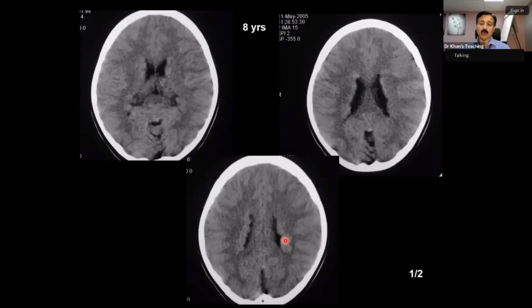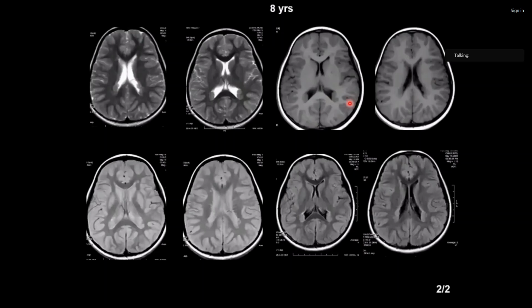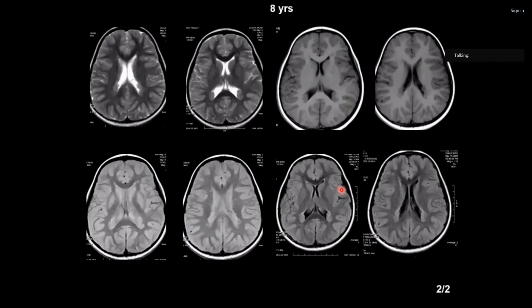Hello? On a CT scan, and you can see these nodules, bilateral nodules. And on each sequence, which will be T1, candidate 5, can you hear me? Yeah, it's going on and off actually, sorry. Yeah, there was a notice on my Zoom that my internet connection is playing up. I am in the hospital, so this is the official connection. I hope it is working now. Can you hear me now? Yeah, it's fine now actually. It was just very sporadic a bit earlier, but I can hear you now.